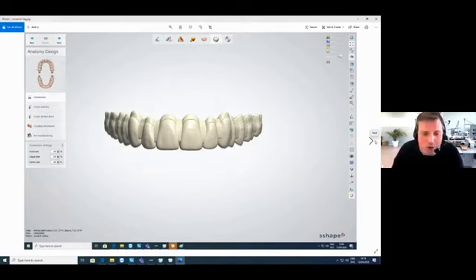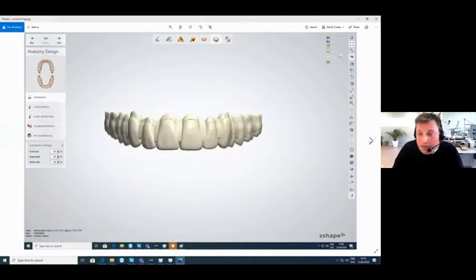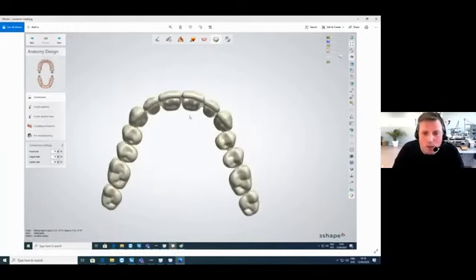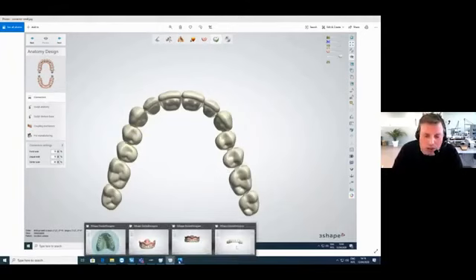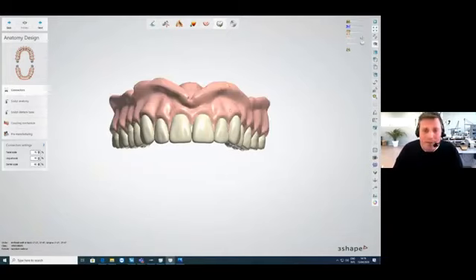There will be enormous connectors, and it will not be aesthetic at all. But it's an option, you can do it, and this shows what will change when you move it to a really high or low setting. For me, the lowest setting works the most aesthetically.